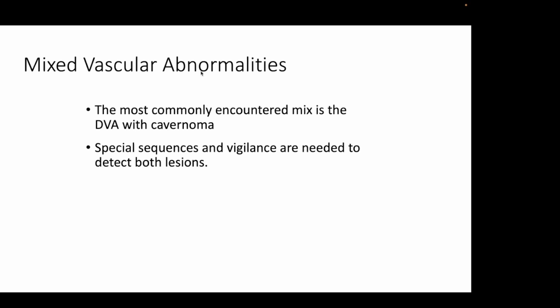Now, I mentioned these mixed vascular abnormalities. And the most commonly encountered mix is the DVA with the cavernoma that I showed you.